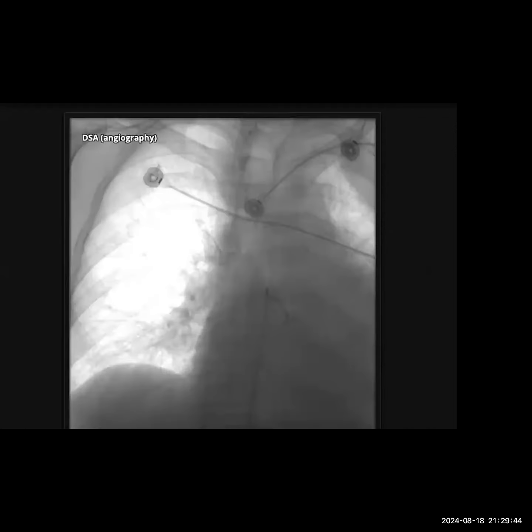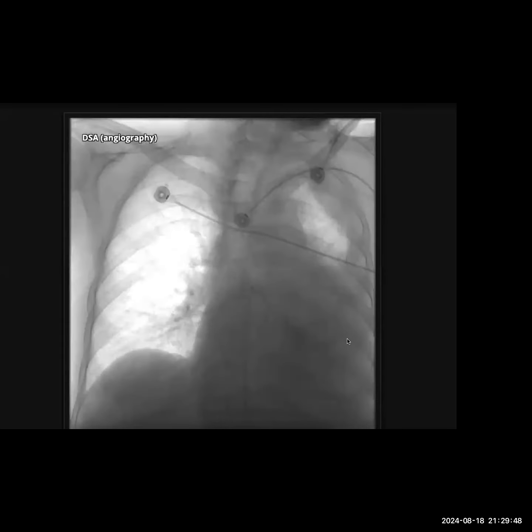Okay. Next, I think this was a case of a bronchial artery embolization. The first image I showed you was of tortuous bronchial arteries. Okay. And like you said, there was blush, so the patient had hemoptysis. The answer I was expecting from you was the artery of Adamkiewicz, which can sometimes arise from the right intercostal trunk, right?